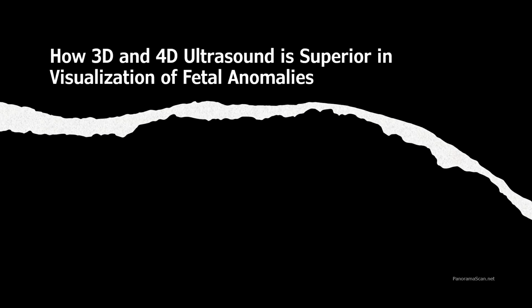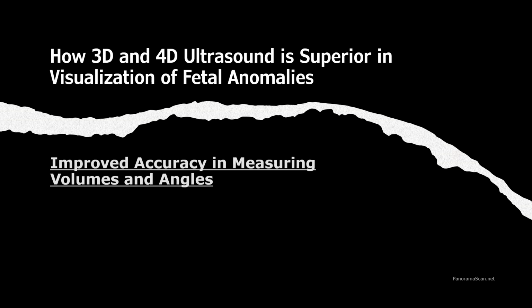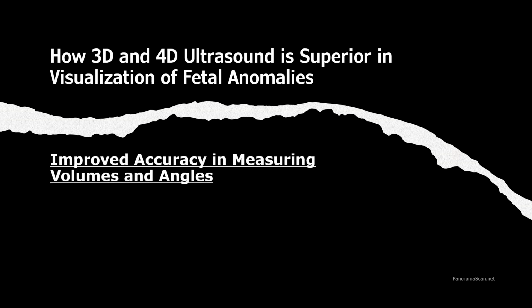Another advantage is improved accuracy in measuring volumes and angles. This is one of the key benefits of 3D ultrasound, as it allows for precise and detailed measurements that are crucial in assessing fetal development and anomalies.